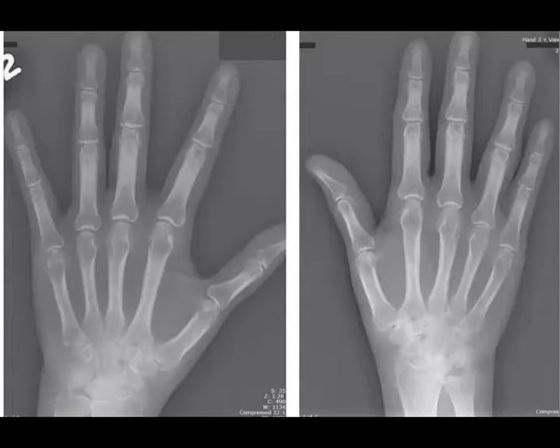Okay. So rheumatoid arthritis, like female gender, symmetrical distribution. And you will find the periarticular osteopenia. Nice. The differential diagnosis will be osteoarthritis, but you should find osteophytes, or maybe the joint space will be asymmetrical involvement if you have two joints. The psoriasis will be one of the good differentials. So what is the difference between psoriasis and rheumatoid?